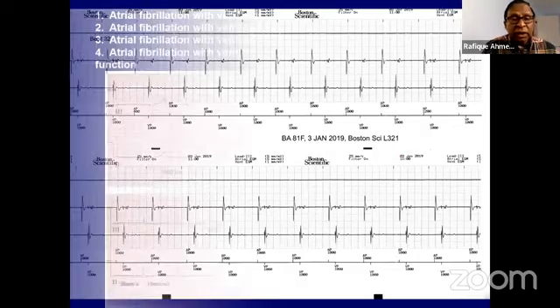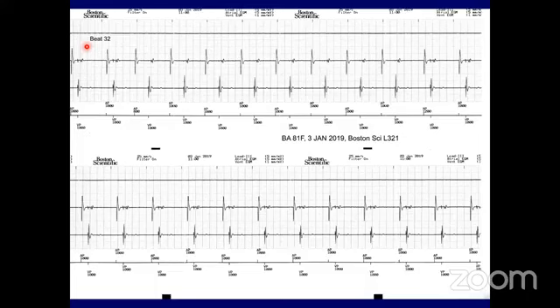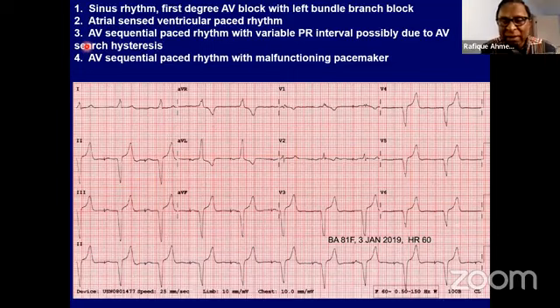Thank you. Sir, there's a question. Why is there an RBBB pattern in the ECG in V1? Can it confuse the... Yes. I wonder if there is a degree of fusion. I don't have the baseline ECG on this patient.